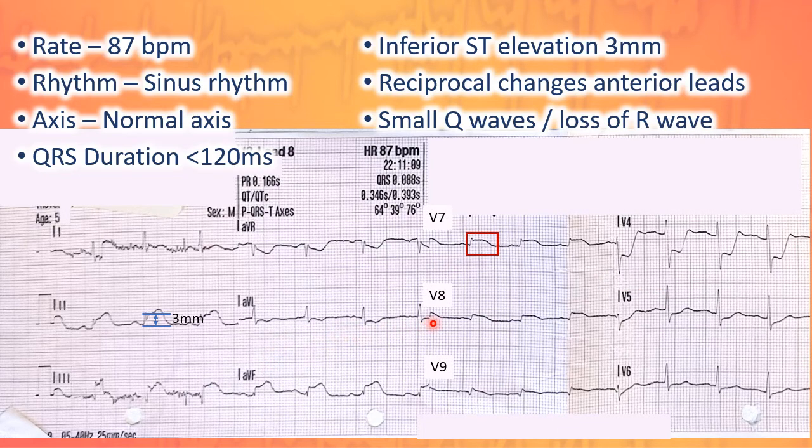They should have been called V7, V8, V9 on the ECG and crossed out the V1, otherwise it leads to confusion, and there's nothing on this ECG otherwise to tell you that this is what they've done.